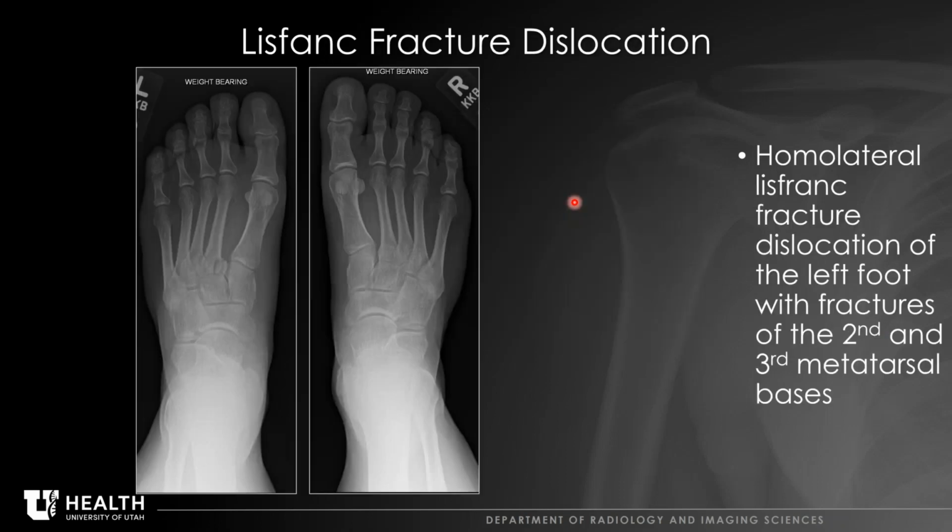And then here we have a Lisfranc fracture dislocation. So these are becoming more and more known by people just because of sports injuries. What we see here is the right foot. These are weight-bearing radiographs. If you're concerned for Lisfranc fracture, you need to get weight-bearing radiographs.